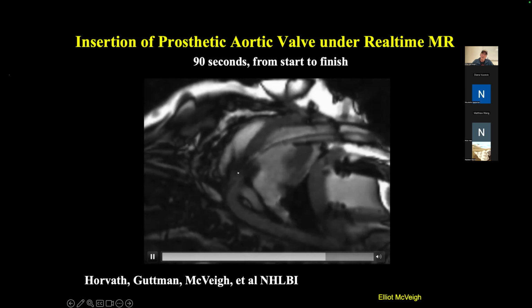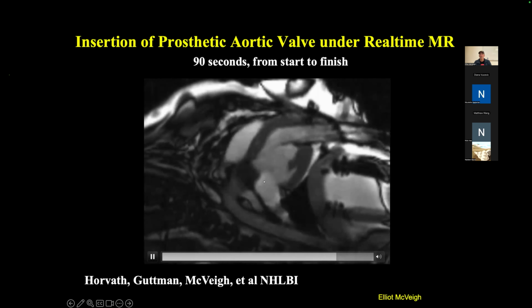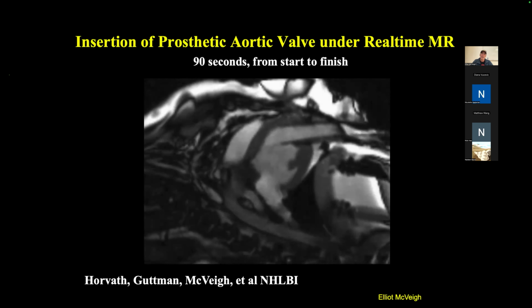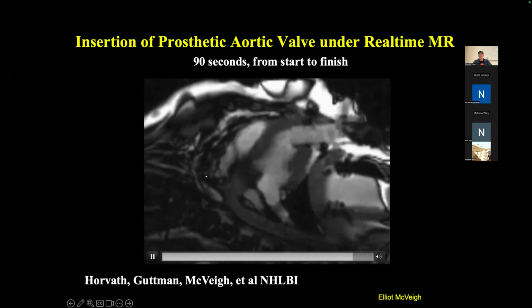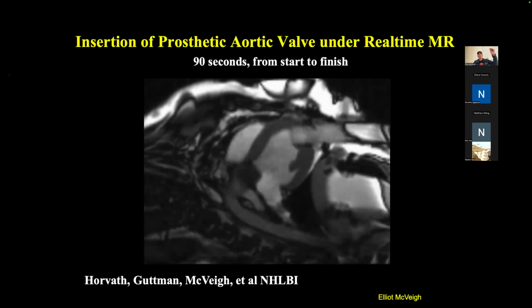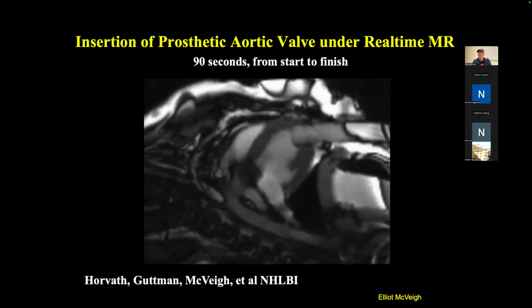Then we've left the valve in, we pull back the rest of the hardware, and you can just do 4D flow in place to make sure the flow is coming through the valve okay and make sure that there aren't leaks on the side, etc. Again, a fantastic application, but it's a reach to try and get this into your everyday cardiology cath lab. It's in a dozen cath labs around the world, but they're all at the top institutions with really exceptional cardiologists running them.